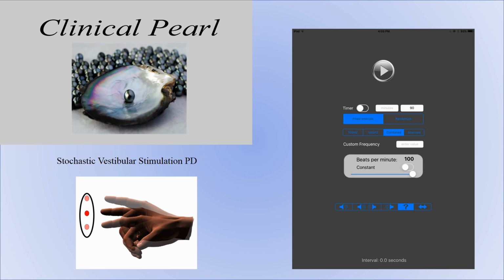People have asked me why I prefer the wired bone-conducting headphones versus the Bluetooth version. I found with this fast application that the Bluetooth type of headsets tend to degrade in quality, where the wired version of the headphones maintains stability over fast and long output.